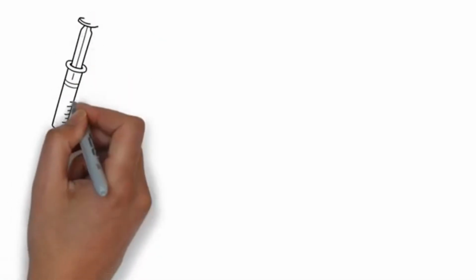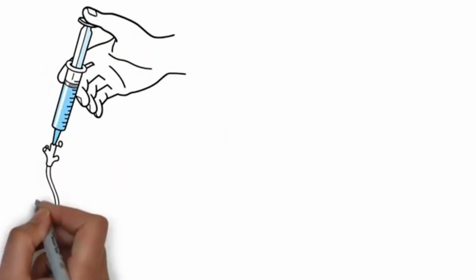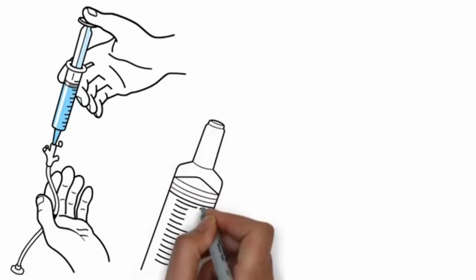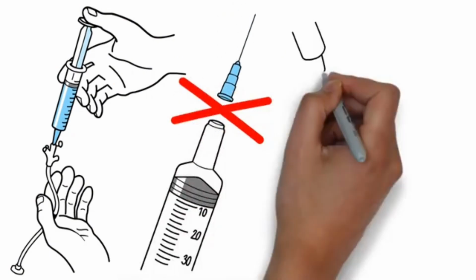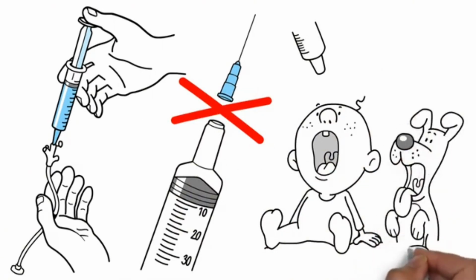Catheter tip syringes are the largest size common style tip design, used primarily for irrigation and similar applications. Oral dose syringes look similar to a luer slip tip, but are oversized to prevent a needle from being attached. Oral dose syringes are commonly seen with oral medication, especially for pediatrics or animal medicine.